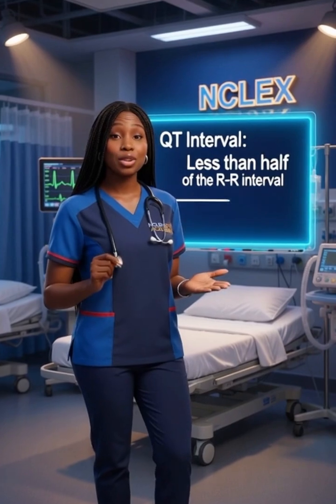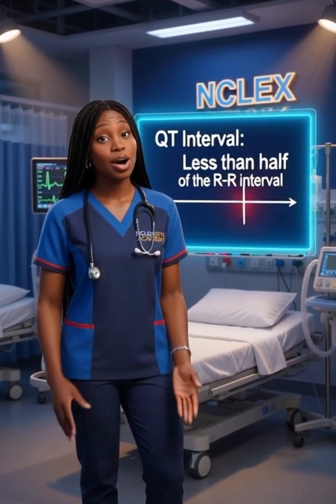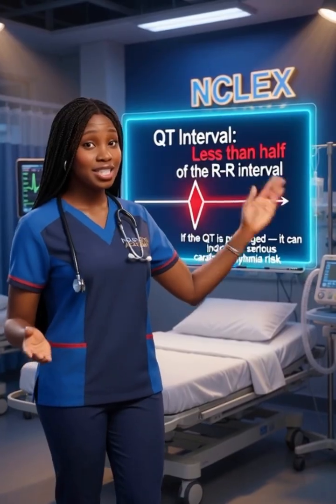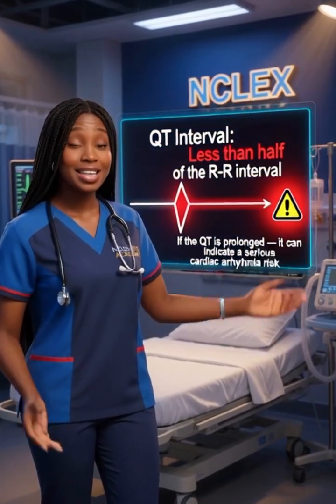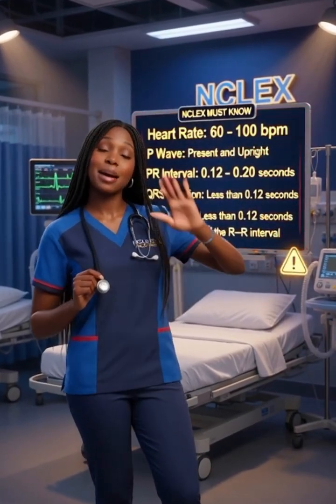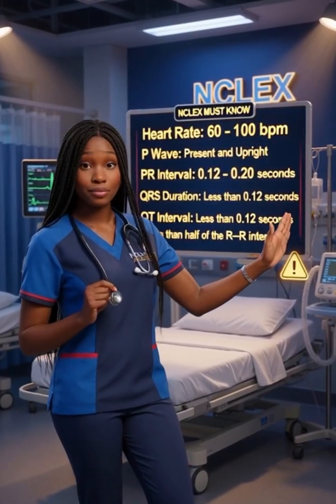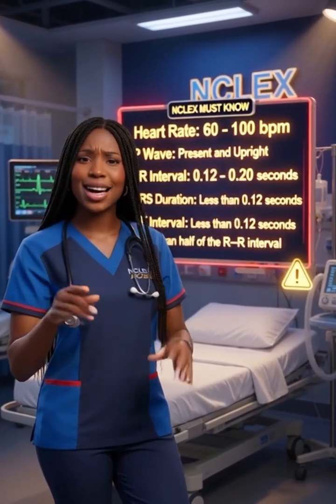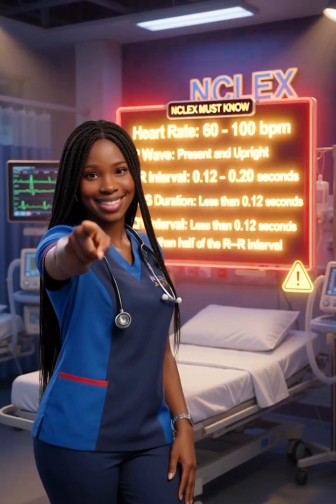The QT interval should be less than half of the RR interval. If the QT is prolonged, it can indicate a serious cardiac arrhythmia risk. This is a big NCLEX topic. If any of these values fall outside the normal range, it may indicate a heart problem. Know these values by heart. They will definitely appear on your NCLEX exam.